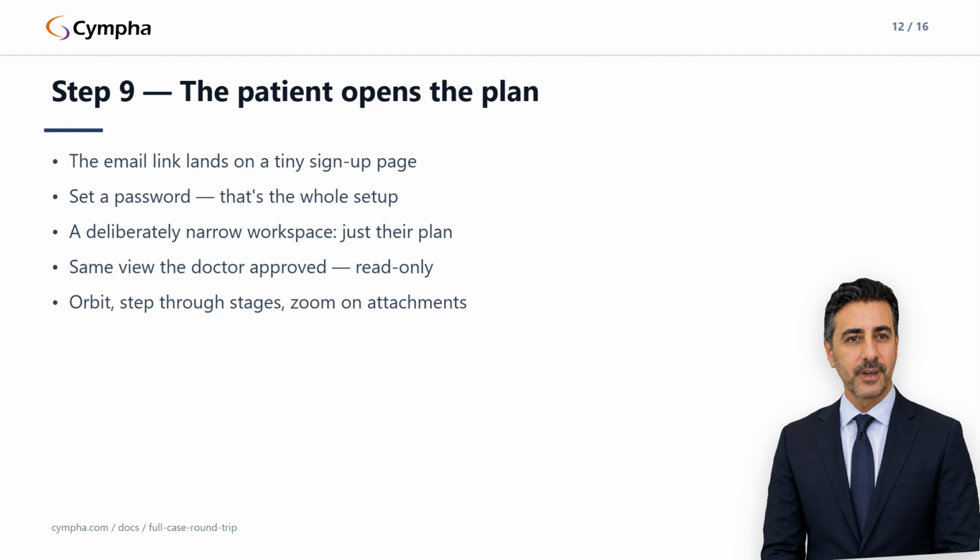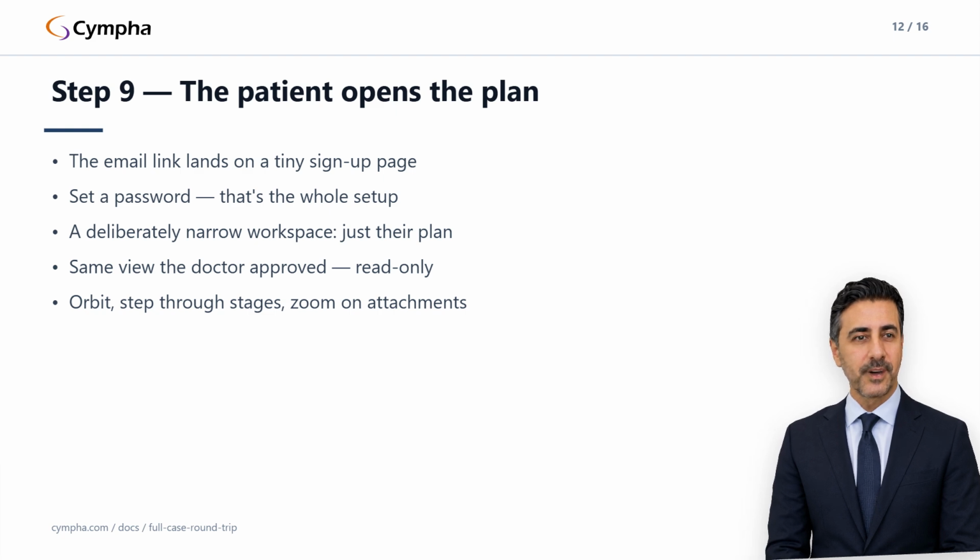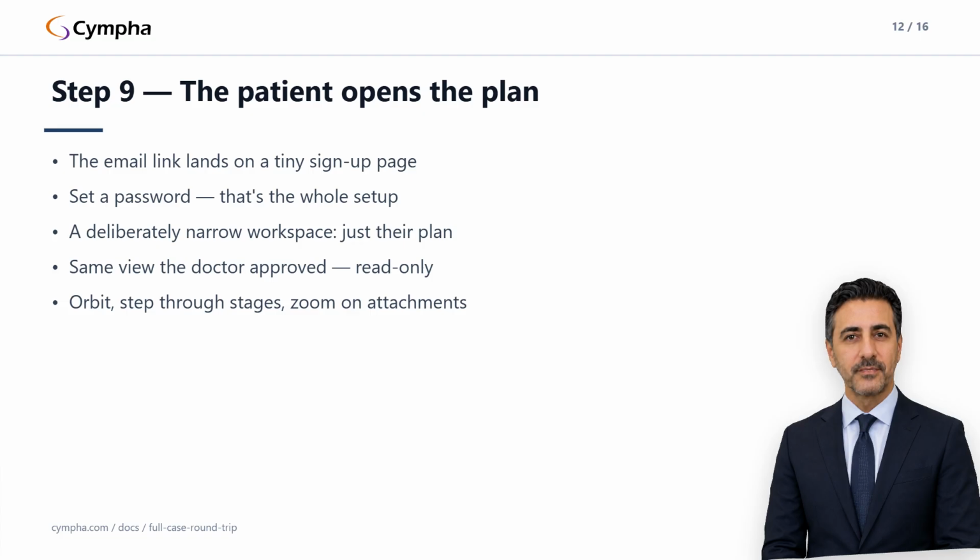No app store, no download, no account maze, no waiting for a receptionist to call back. That is the whole point of the round trip, professional machinery on one end, a single clean link on the other. The patient side walkthrough is open your treatment plan as a patient.